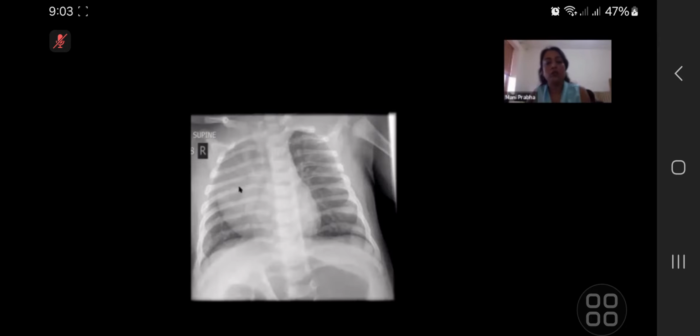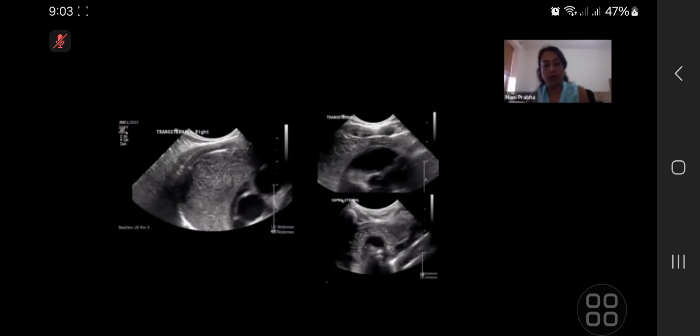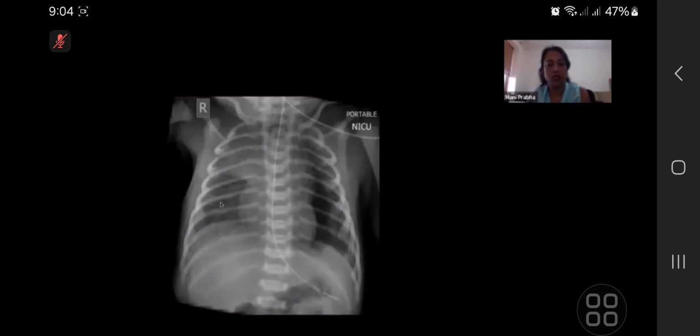So these are the points you should consider: density of the lesion, outline, and homogeneity. And if you are still confused, you can ask for an ultrasound scan. These are real life scenarios when we find it difficult to say it is definitely thymus, and then we move on to ultrasound. On ultrasound, we see a starry sky appearance, that there is speckled brightness amongst the homogeneity.